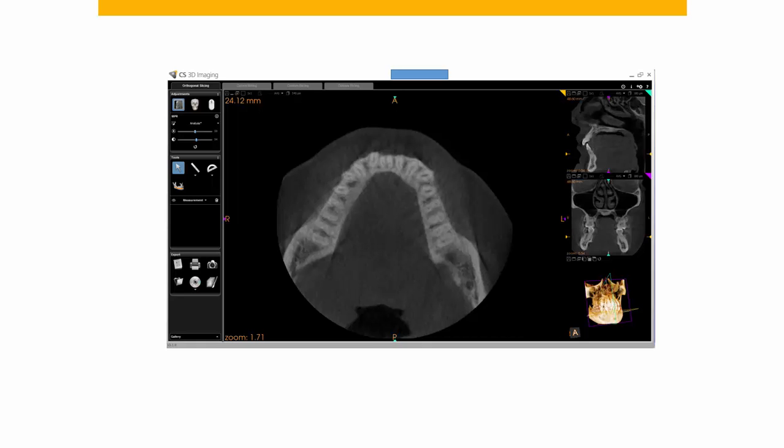You also need to consider the bone support for the final position of the tooth that you're going to move. Is there enough bony path to properly retract or maneuver the tooth to its final position? And in the final position, is there enough bone there?